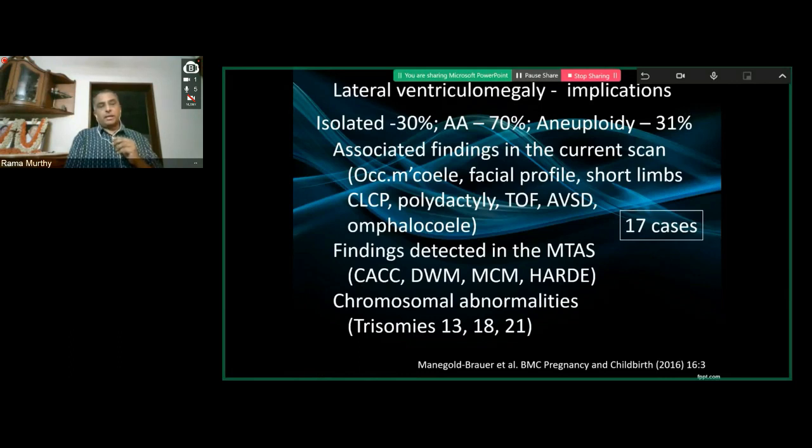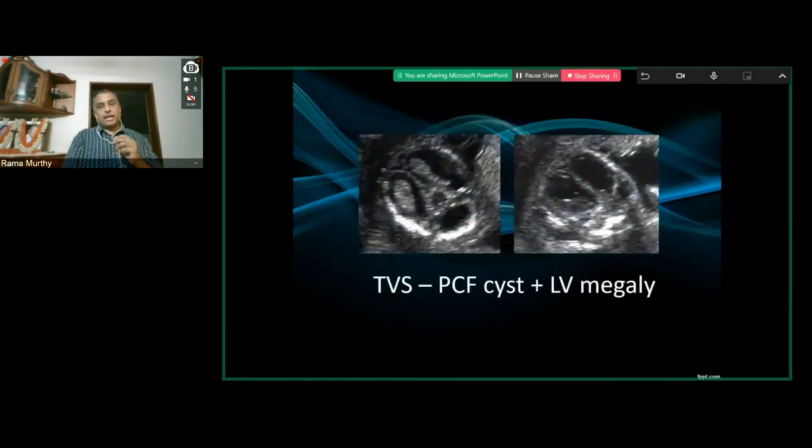So let's look at this case. In this case, the lateral ventricles are dilated. The choroid plexus looks limited, and there's a posterior fossa cyst, a huge cyst in fact, pushing the cerebellar hemispheres right against the walls of the posterior fossa. So that is a straight case of lateral ventriculomegaly. But remember, the measurement doesn't help you. The look helps you. More fluid, a small contained choroid plexus, right?